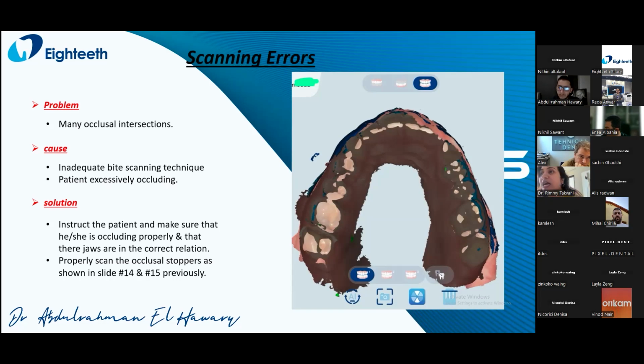At that time, I would want to upload the scan and edit only that particular area which has less clearance, which apparently either I did not know or was missing in the previous software I'm using.